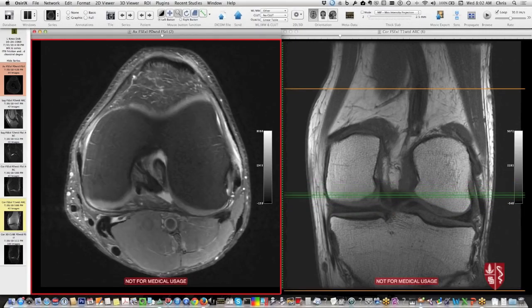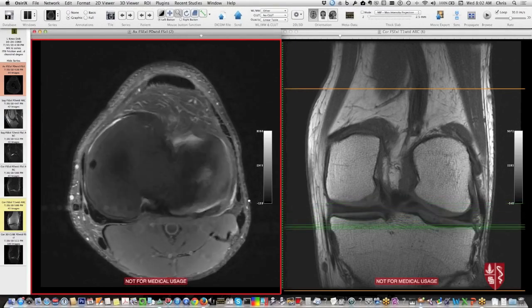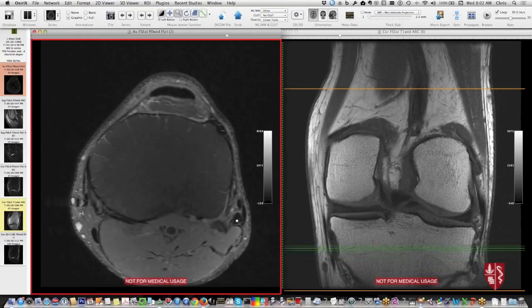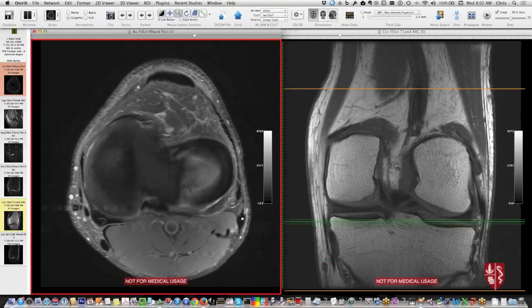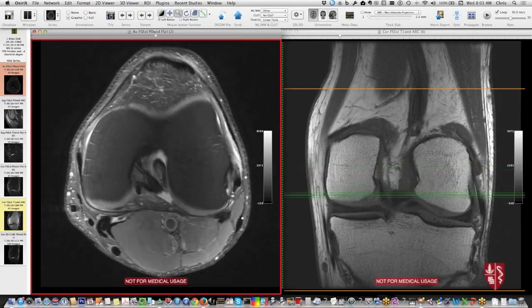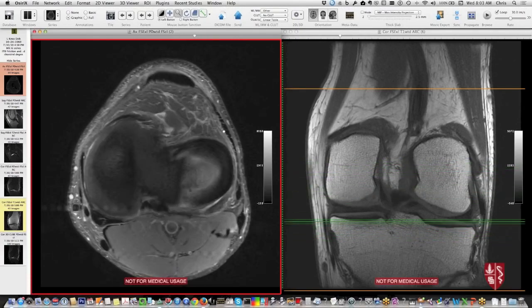You can really nicely follow it going down to join up with this tendon, or insert on the fibula next to it, that conjoint tendon of the biceps femoris here. So this is biceps femoris, fibular collateral, and then the IT band is anteriorly.